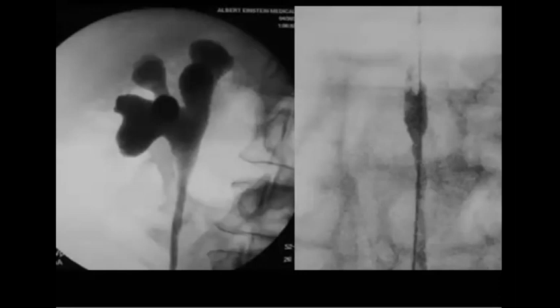So this is like a retrograde pyelogram, and what you have here is like hydronephrosis. Yes. And I see that someone mentioned the goblet sign of the ureter, transitional cell carcinoma. Yeah. So where is the goblet sign?